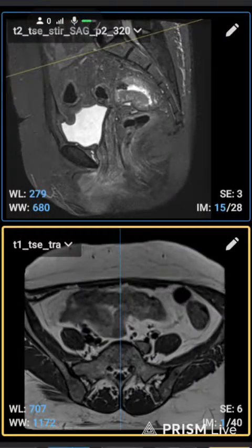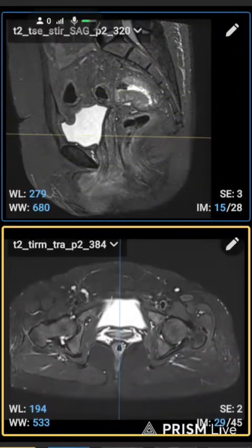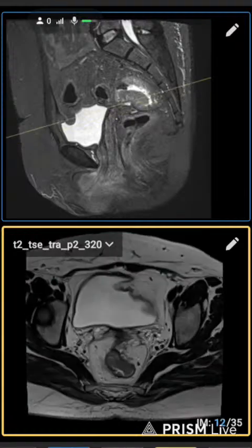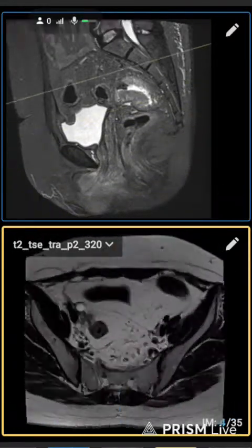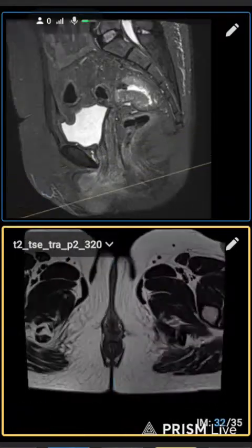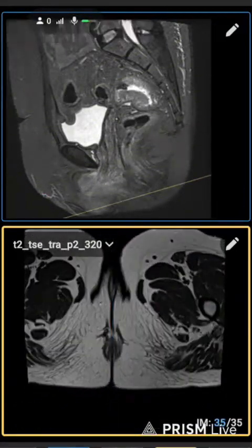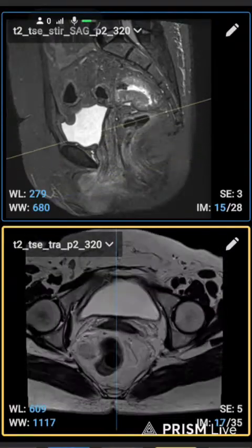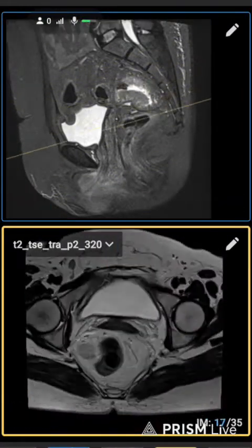In this patient we don't have it, but there is one T1 FS, its plane is axial, and a diffusion sequence is also needed. After that we can add the contrast sequence. So if there is a rectum growth, the planning looks like this.